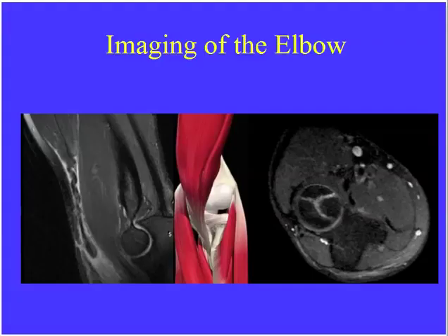Okay, so that's what you need to know about the shoulder. You need to be able to identify SLAP tears, anterior and posterior labral tears, the Bankart, whether it's osseous or fibrous, the Hill-Sachs defect, and then know the innervation of the muscle groups and be able to identify the muscle and which nerve innervates those muscle groups. We'll move on to the elbow.